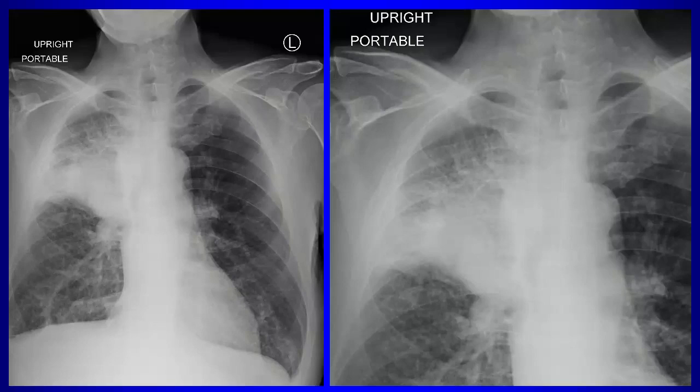Post-obstructive. Well, certainly pneumonias can be post-obstructive, but is there anything here? The fissure is distorted, which suggests atelectasis. Yeah, you can get some volume loss with pneumonia. You can get that. Is there what? Where? Hilar? What's this over here?